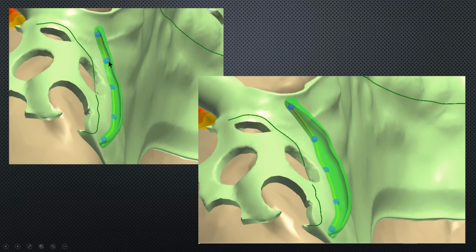Finish line. So this is kind of our default for a metal frame. Again, I want that finish line to be just a little heavier. I want it to be a little bit more robust. It's again, hard acrylic. Acrylics do not chemically bond with this material, right? The material's great because it doesn't stain, doesn't absorb moisture. Well, that's also a little bit of a drawback when it comes to adding acrylic to it or anything. Now, acrylics don't bond to metal either, all right? So, it's a similar thing. The metal is rigid and the acrylic's rigid, and so when they come together, they really don't move. With this material, you can have some slight movement, so having a little bit heavier butt joint is going to allow for more thickness of materials there, and it keeps that area solid and rigid and keeps any kind of staining down to a minimum.